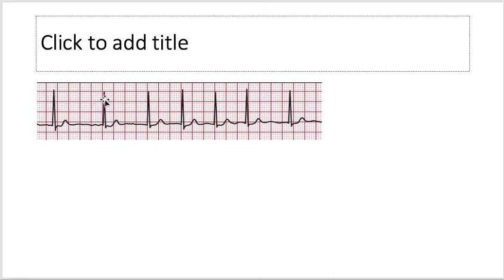That way, to determine whether there's the same distance between the other R intervals down the rhythm strip, all you have to do is, if you have those ticks on the sheet of paper, slide it down to the next one. So the tick that was here, you put onto this R wave here, and the tick that was on this R wave then gets pushed down further. If the two ticks line up perfectly onto these two R waves, you can imagine that it's a regular interval, as it's the same RR interval between them. Then you just keep shuffling it down the line. So with this one, you'd probably notice that the second tick is a little bit past this R wave because this is a smaller gap than this is. That points to the evidence that it's irregular.